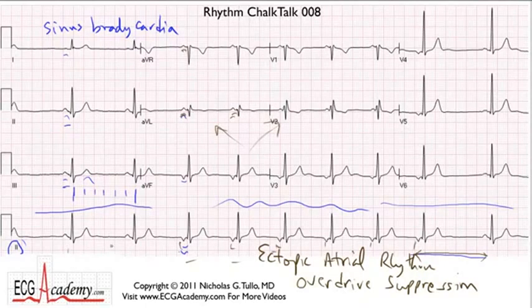But here, what do we have? We have a sinus bradycardia. It's very slow, I mean to say. And so that allows some of these ectopic atrial foci to gain footing and create these arrhythmia problems. But when the ectopic atrial focus stops firing, then it takes a little while for the sinus node to kick in again because of overdrive suppression of the sinus node. We see this commonly in sick sinus syndrome, where you have a tachyarrhythmia and then post-tachycardia pauses. The common cause of lightheadedness in patients with tachy-brady syndrome.